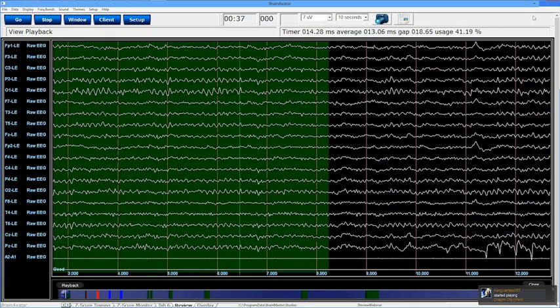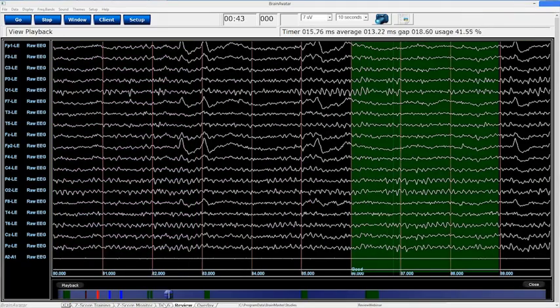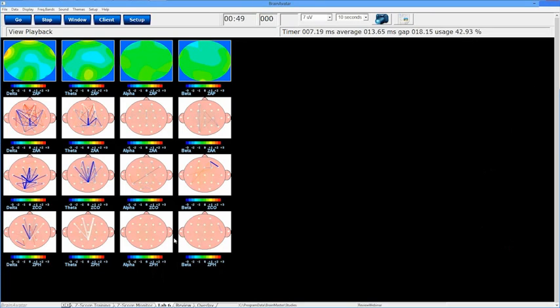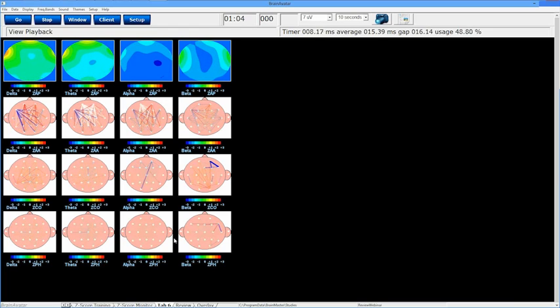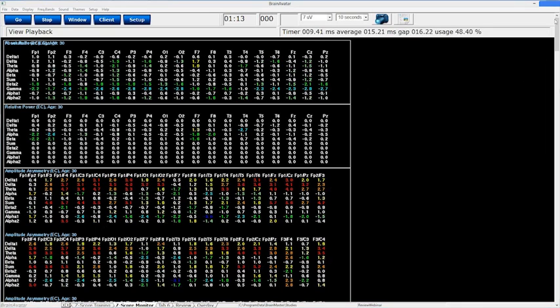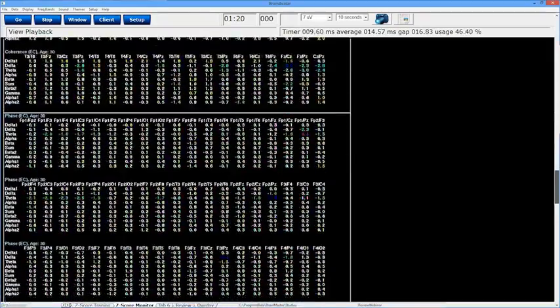So now, where and why would I want to do something like this? The reason I would like to do something like this is because if you build a special review folder like I have, you can have different features and functions playing back on each and every tab. You can see more in depth now, as opposed to just looking at the EEG information, what's going on with your client as far as what the information is going on with the training. This allows you to do a very simple review of exactly what's going on and how they might have responded to training, should have training been going on. You can basically put up any different display that you have options for in training in a review session now.